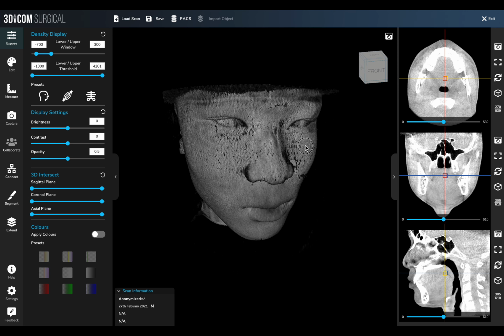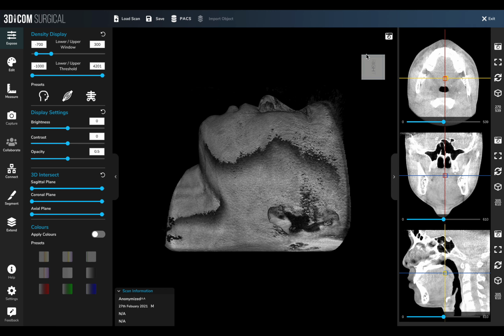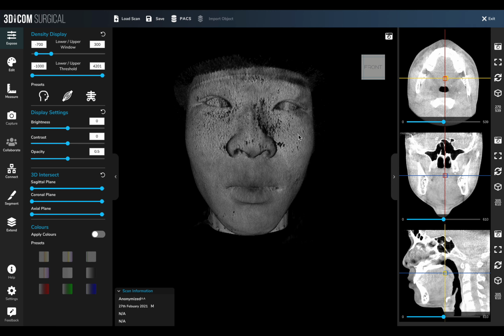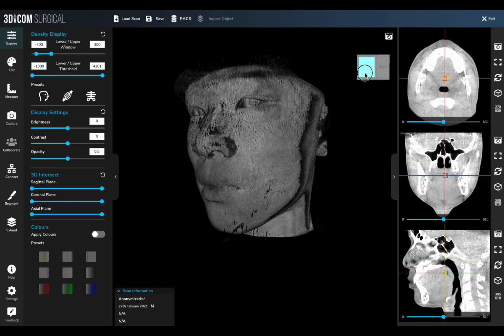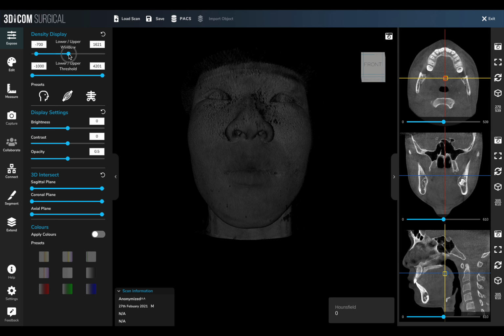So as we move around, it also seems to be rather buggy. If you try and click on the front view, it doesn't work from the sides. But if I click on right and then front, it works. So anything off kilter when you're still on the front view doesn't actually recenter the scan. Up here, you still need to be able to hover over the top of these and actually get preset labels that appear saying skin, muscle and bone.